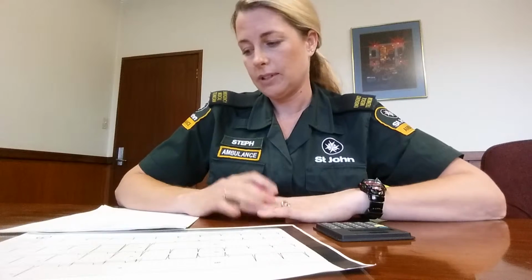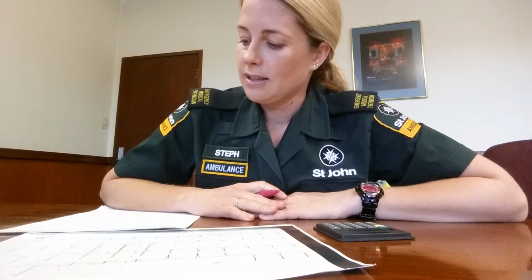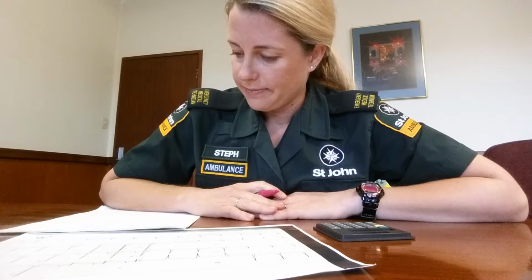Okay. By posterior ECG, you see no ST depression or elevation. Okay. So then I would just stick with the Wolff-Parkinson-White. Okay. That's your interpretation. Great. So there are 2 questions to go along with this. What is the accessory pathway known as in Wolff-Parkinson-White, and why does it show a widened QRS with a delta wave?